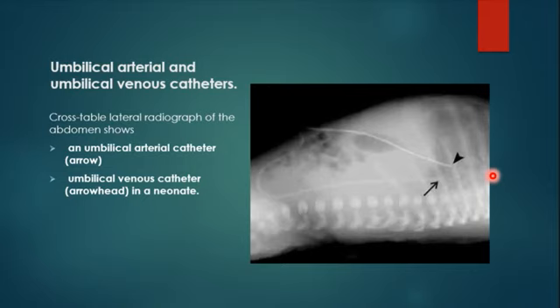If you reach this level, from T12 to L2, there is more liability to have thrombosis, for example, or you could injure the renal arteries. So they avoid this site. It should be either very high or very low, not from T12 to L2. Either above T12 or below L2. But this is also considered normal, because if it is here, this is the problem.